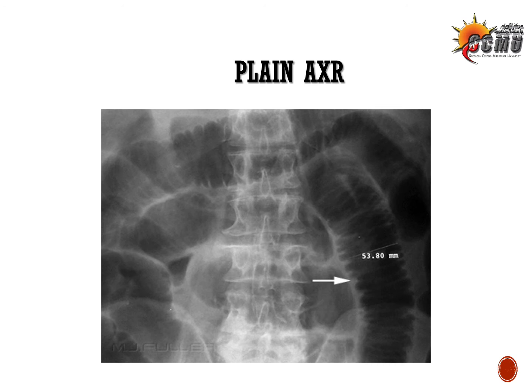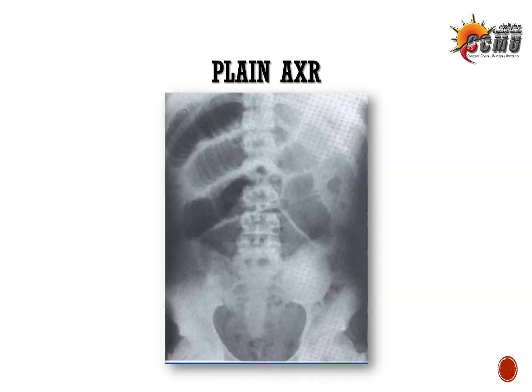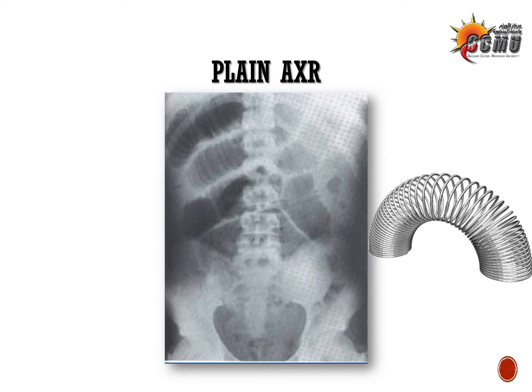With the dilated bowel beyond 3 centimeters, like this one, almost 5.5 centimeters, the valvulae conniventes are closely spaced because the small bowel is maximally dilated to a level that these valvulae conniventes form a sign called the spring coil sign. It's like a coiled spring, and this denotes small bowel obstruction. That's exclusive for small bowel obstruction. So again, it's very clear. Yeah, this is small bowel obstruction.